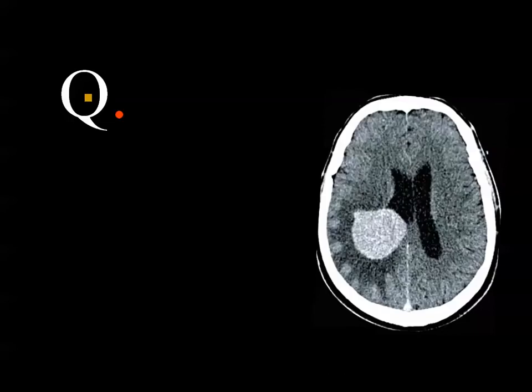Yes, the most common homogeneously enhancing intraventricular tumor is the meningioma. And the meningioma will show most of the criteria of meningioma, like homogeneous enhancement, a smooth margin, may contain calcium. This edema around the tumor is due to entrapment of the occipital horn.